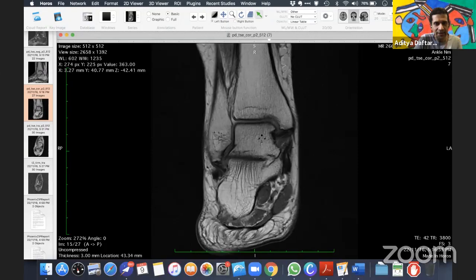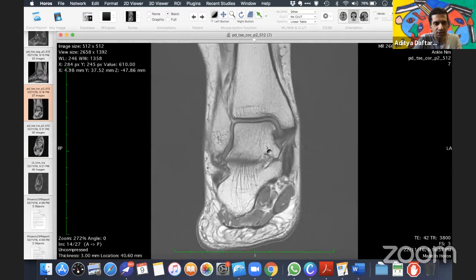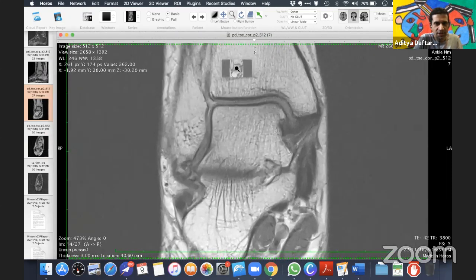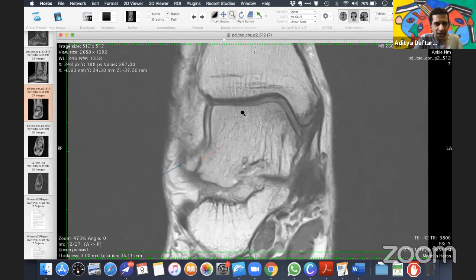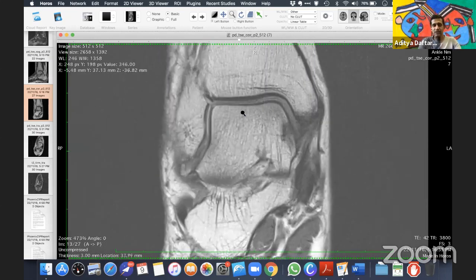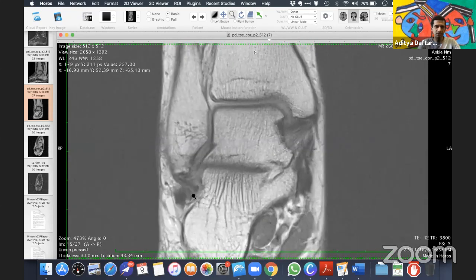But before they did anything, they would want to see what is the status of his cartilage. So they'll want to look at this cartilage here, zoom up and see, okay, fine, this cartilage quality is quite good. So it makes sense for us to do something. Also, this patient has quite a bit of heel valgus. You look at this, there's major subfibular impingement even here. So if you come back here, see how this area between this, when this person loads, these two things will come together next to each other. So this patient will develop some subfibular impingement. There's also some heterogeneous signal in the deltoid here. So you know this person will also have some medial laxity.